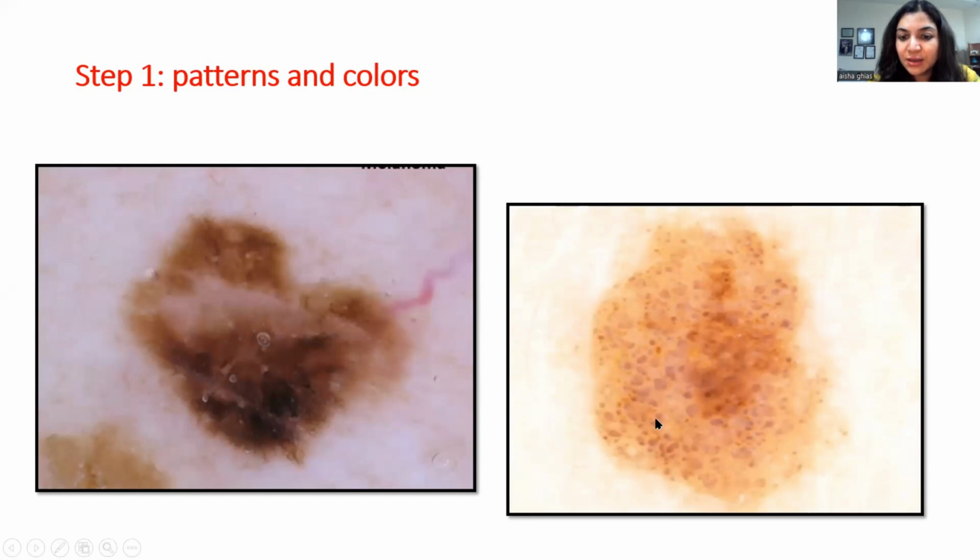The clods are smaller, dense objects, and they are of single color. They are of multiple shapes. If they fit in together, they constitute a cobblestone pattern, but over here, they are not fitted tightly together. They are scattered here and there. So they constitute the clods. Some of them are smaller, some of them are bigger, but their distribution is symmetrical.